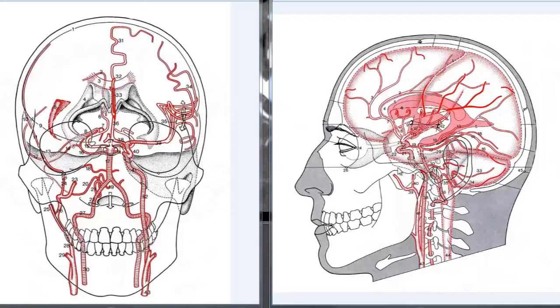Just beyond the skull base are the first opportunities for the blood to flow out at a branch point. You have the ophthalmic artery that comes off here. You have, if there is a posterior communicating artery, a PCOM present, it's going to be here. So just below the terminus is the first point where you have any potential for collateral channels to be present.